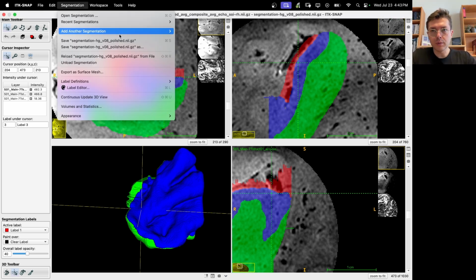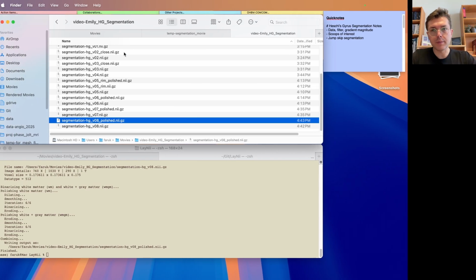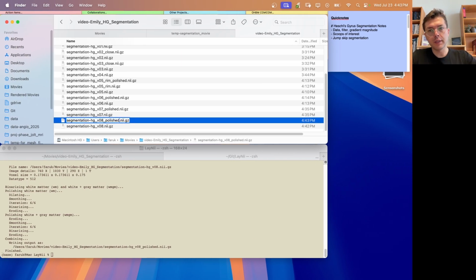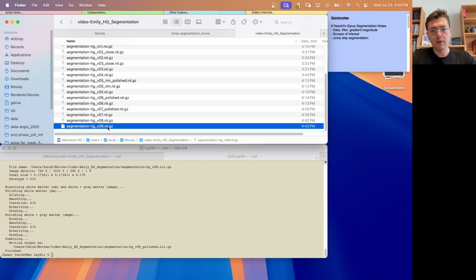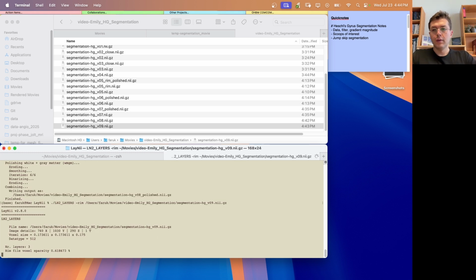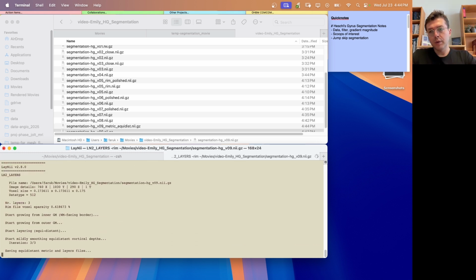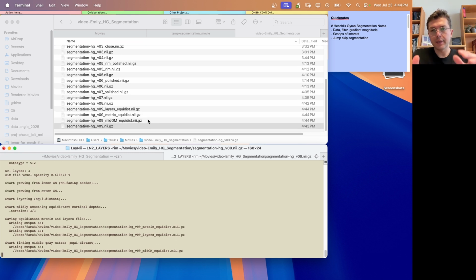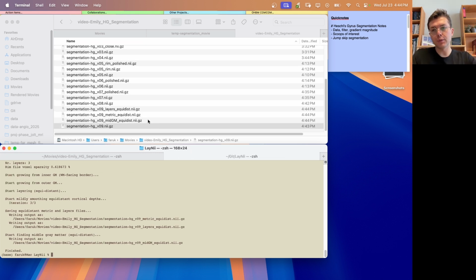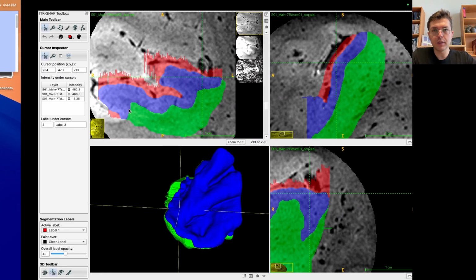Okay, so this is good. Now I'm going to switch to computing layers on this data. Let's call it 9. Okay, layers. It is just the default values without anything else because everything is optimized for exactly this resolution. So that's why we don't need to worry about anything else.